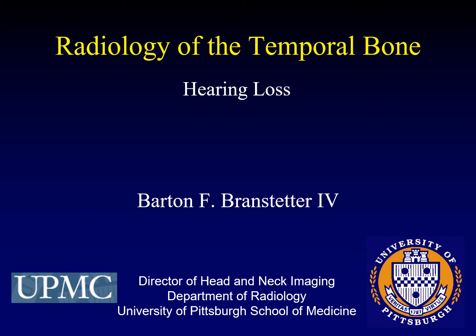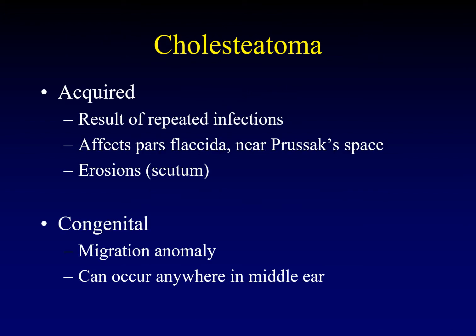This is the second half of the lecture on the imaging of hearing loss. Cholesteatoma is one of the most important diagnoses that we deal with in the temporal bone. Cholesteatoma is a keratin collection. It's not actually a neoplasm because it's not cellular.